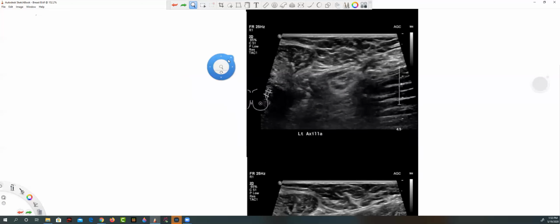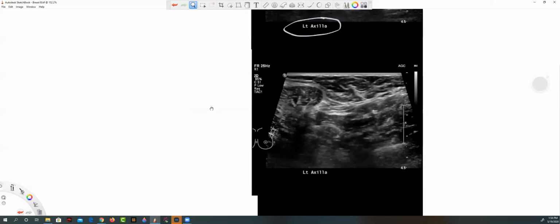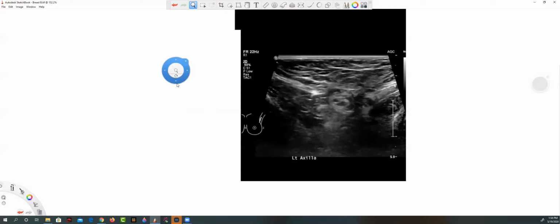Another image of the nipple. The fibroglandular tissue is coming up to it, but we don't even see the nipple itself. So like I said, either they're just off to it, or that nipple is so soft that it's just squeezing out perfectly. And then, of course, if you're going to do a full exam, you're going to do the axilla. Absolutely, positively. You can see the body mark is going up into the axilla. Another axilla. Another axilla. But in all those pictures, there's really nothing to see.